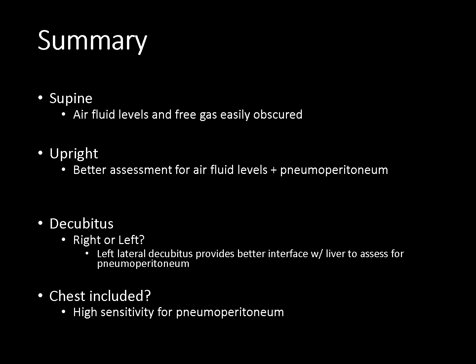So in summary, we talked about the different views of the abdomen. We went over kind of how these views relate to what we're seeing in terms of air fluid levels and free air, what goes dependently and what floats antidependently, and really the concept of how we want to catch that edge between the two densities in parallel in order to see it, so it doesn't hide on us in the radiograph. So we talked about supine, upright, and decubitus views, and how it's important to include an upright chest if you're worried about an acute abdominal pathology.